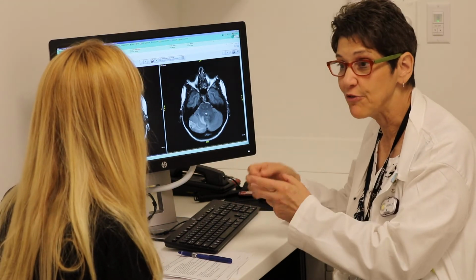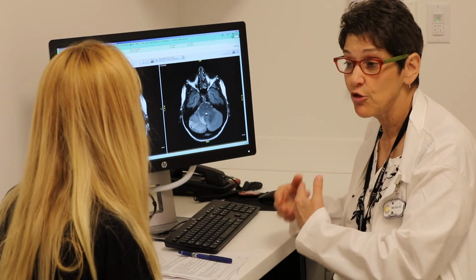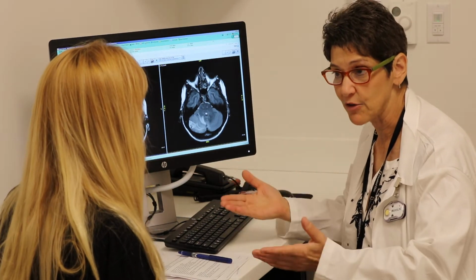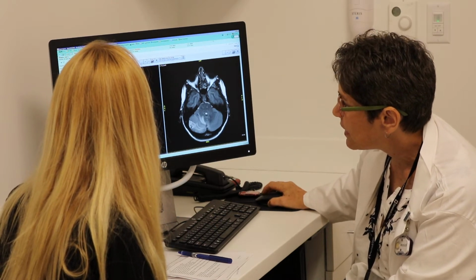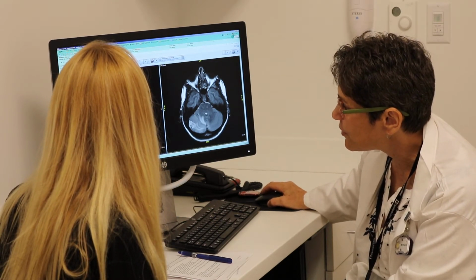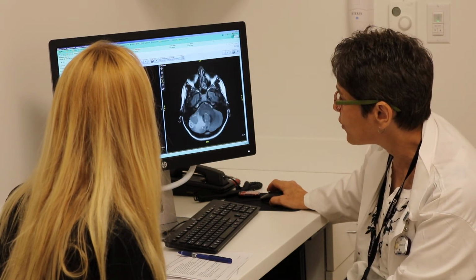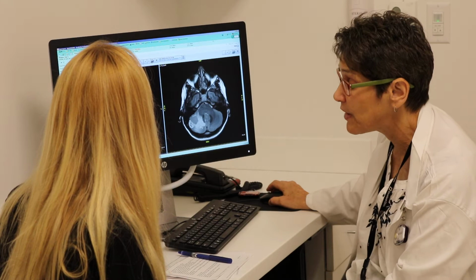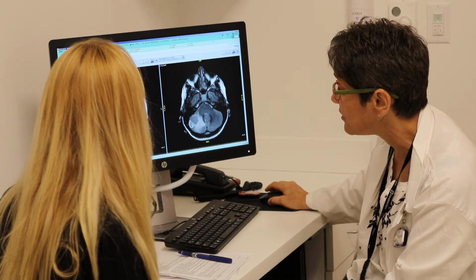If people have little infarcts, which has nothing to do with you, it'll show as white. People with MS, it'll show as white. So you have to interpret what that is in context to the story. This flare change around here, see that, we're interpreting as edema or irritation of the normal tissue by this lesion. So it is irritating the normal tissue.